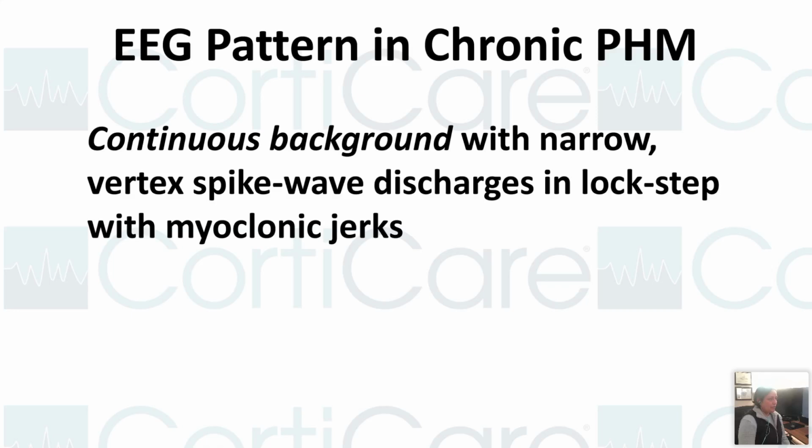I have some examples here. Okay, before that, like I said, on the EEG you will look at narrow vertex spike wave discharges in lockstep with myoclonic jerks. I'm going to explain this again. We did have the myoclonus jerks locked with the EEG pattern when we were talking acute myoclonus. In Lance-Adams, also it is time locked.